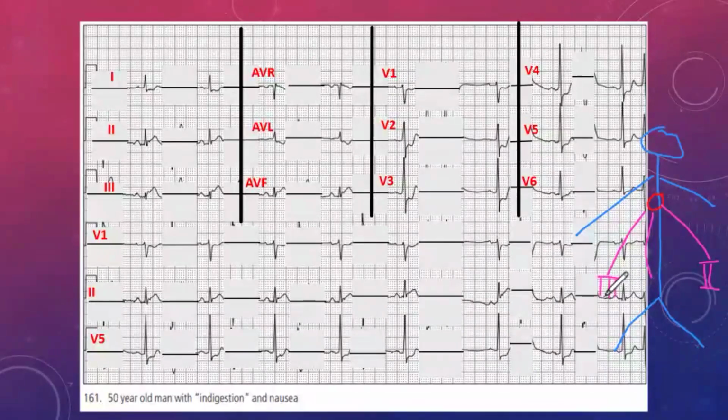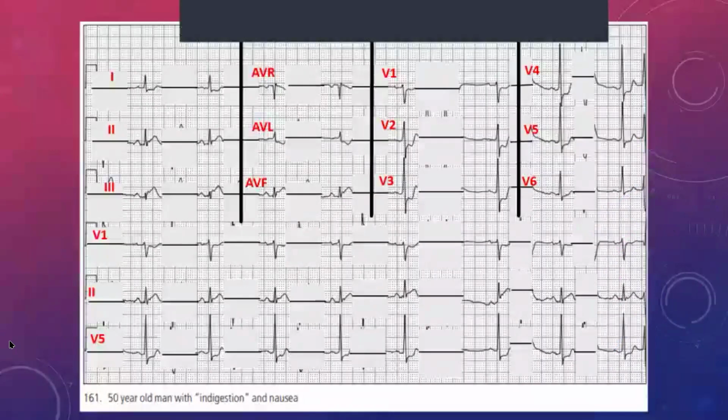Okay. So lead 3 is more towards the right-hand side of the body. So when you start seeing the ST elevations are more towards lead 3 as compared to lead 2, it tells you that the right side of the heart is likely affected as well. So it's not just the inferior portion, which they all are seeing as having an infarct, but the right-hand side is actually seeing more of an infarct. So that's why when the ST segment is higher in lead 3 compared to lead 2, we say that there's an inferior infarct, but with right-sided extension. Okay, I hope that makes sense so far.